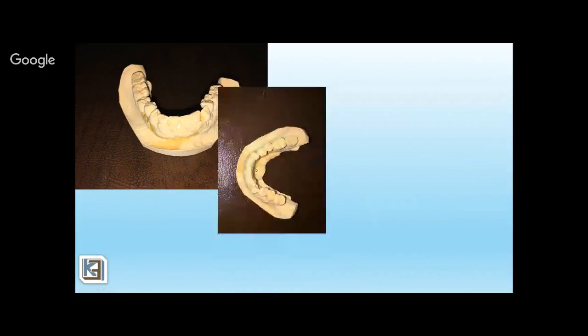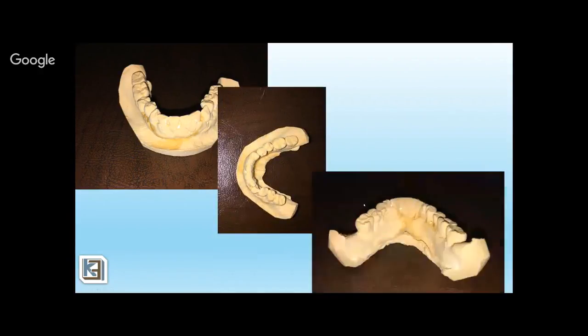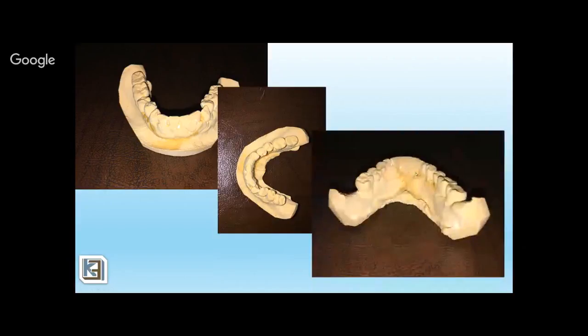This is an occlusal view, and it shows you the line demarking the lingual plate. And this is the lingual plate. Again, this area is blocked with wax, and this is the metal lingual plate, or the periosplint.